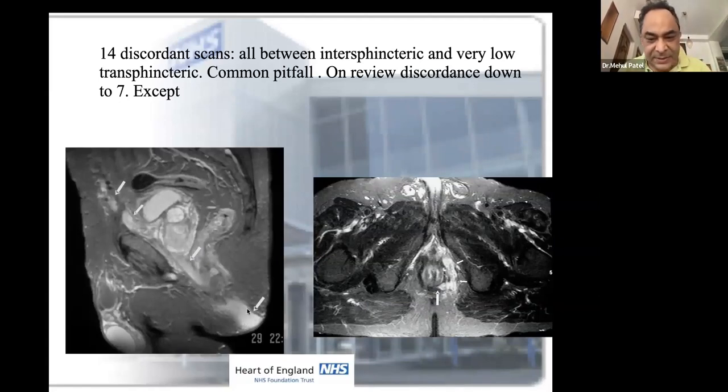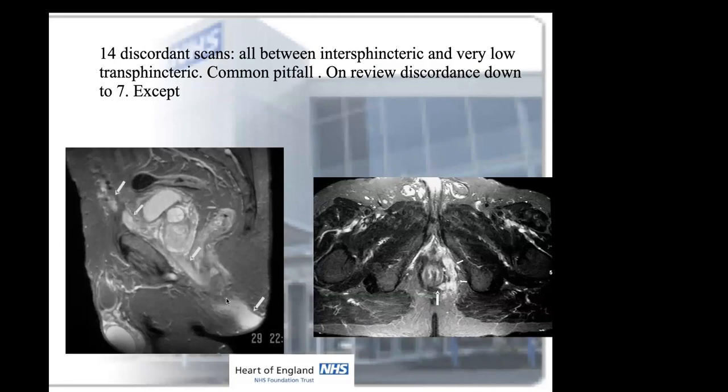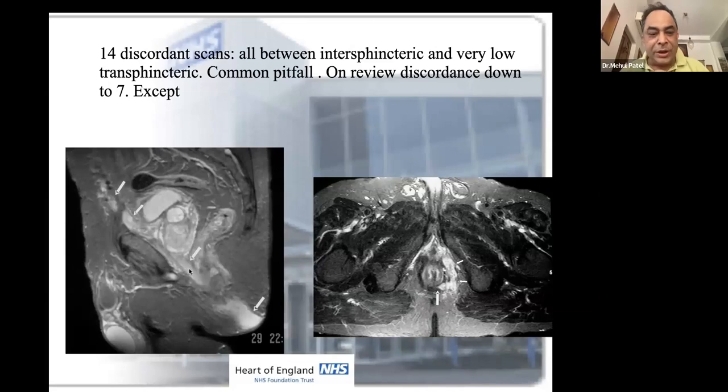This is a large abscess in the perianal region. This is a sagittal scan. I have not shown you sagittal images. The reason I'm showing you sagittal images is to show you the extent. See, this one is going in the pre-pubic, post-pubic space, retropubic space, from the perianal fistula, opening nearly at the level of the umbilicus. So you can see these wide extensions.